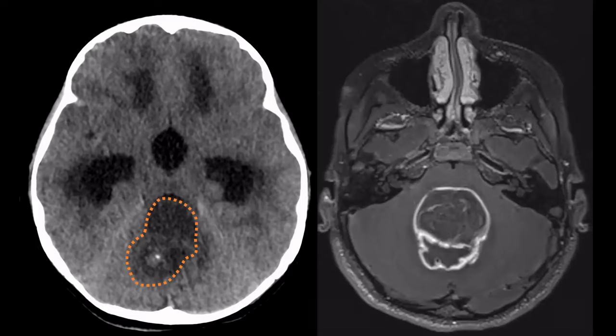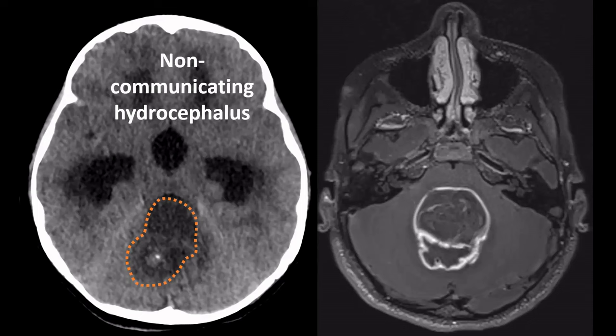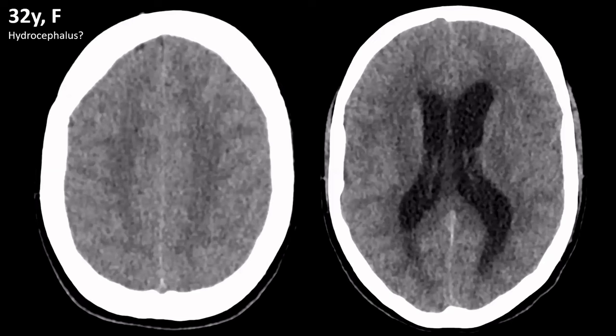This was a tumor in a child. I cannot remember which one it was, if it was a medulloblastoma or something else, but whatever the cause, this patient had a non-communicating hydrocephalus due to an obstruction at the level of the fourth ventricle by a tumor.